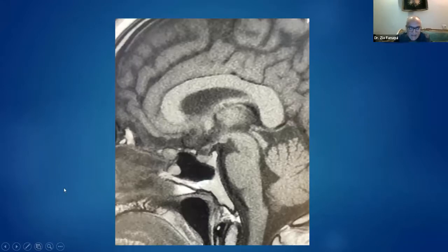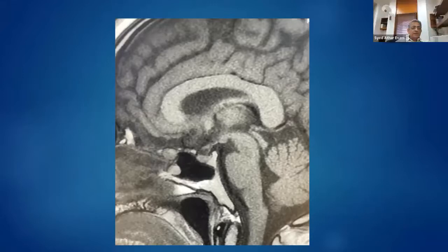Okay. आप बताइए और क्या abnormality है? Very well spotted. ये किसने देखा था ये? I wouldn't have figured that out in this picture. Encephalocele. नहीं, I'm most impressed. Very good.